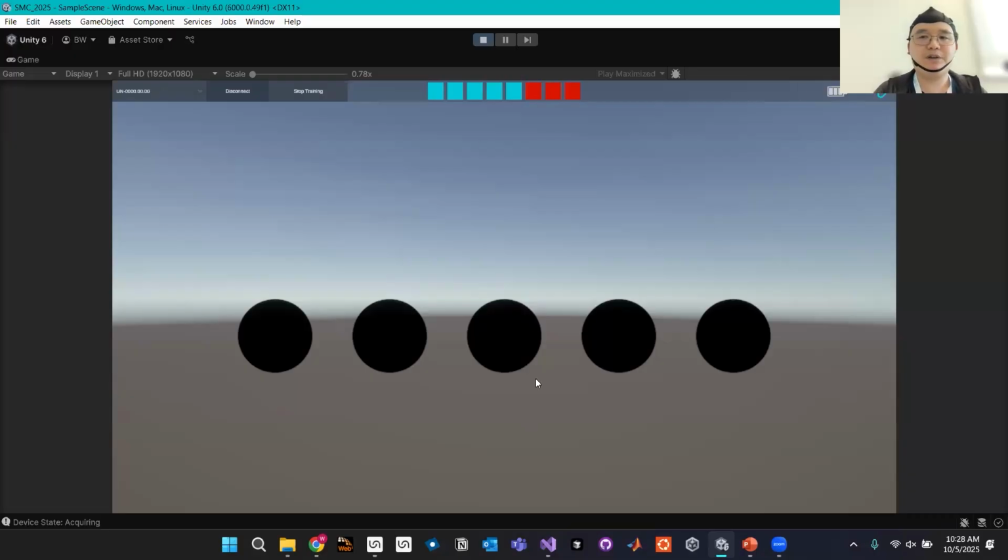So if you want to do a simulation or just for testing, you can count the simulation up to 21 trials, then you can stop. Then it will go to the next step. I think I have more than 21 trials. I didn't count. Yeah, that's right. Then it just took a bit of time for training.